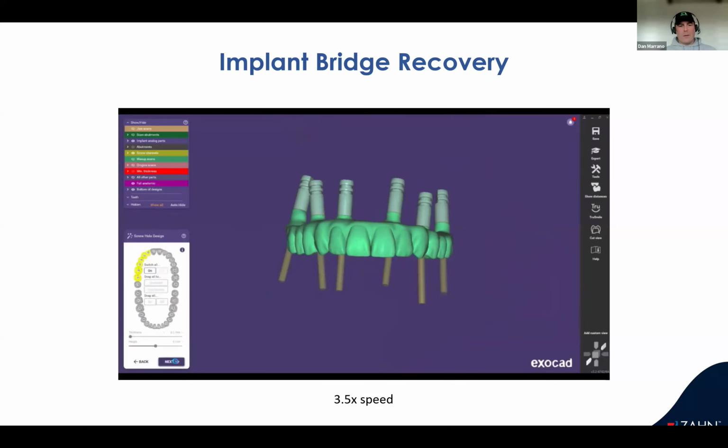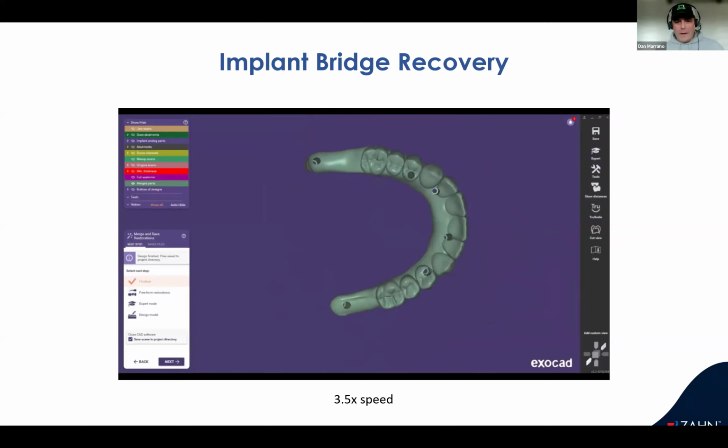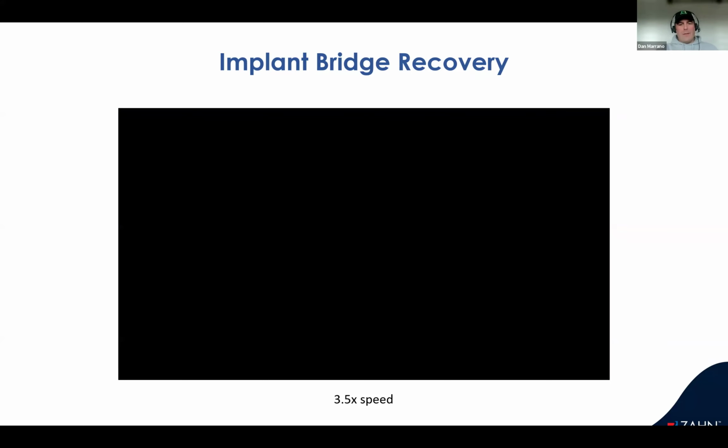And there you go. That would be your wax up that you're stuck on. So again, I don't try to be a hero. They're waiting for this. I'm not going to try to save it. I'm just going to get back and get a run through as fast as I can. And in 3, 4, 5 minutes, you're done.